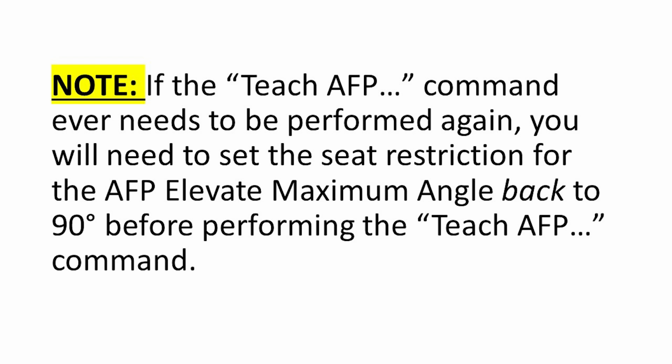If you ever need to redo the teach AFP command, make sure you reset the AFP elevate max angle back to 90 degrees before performing the command, or it will fail.